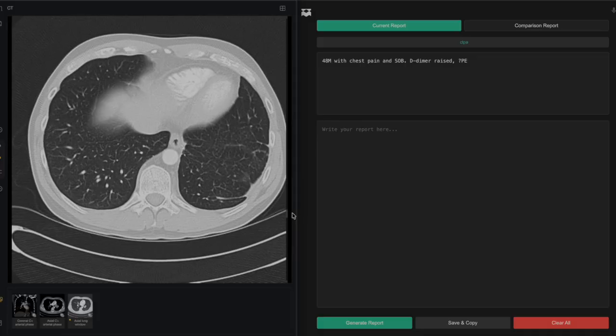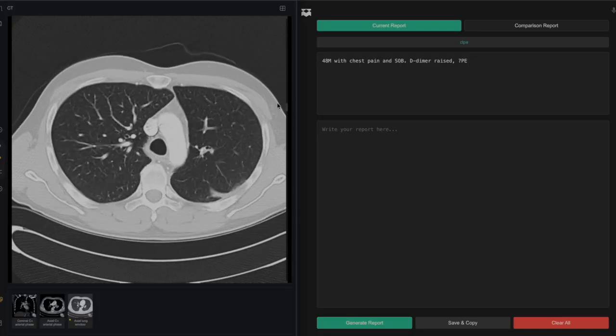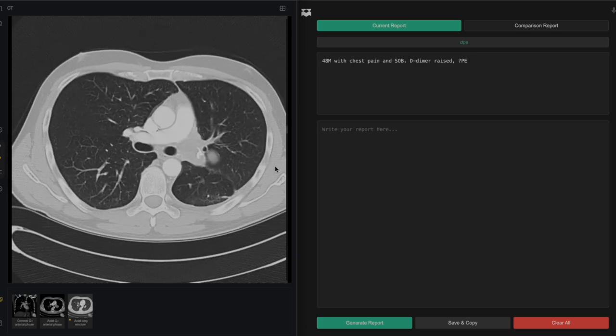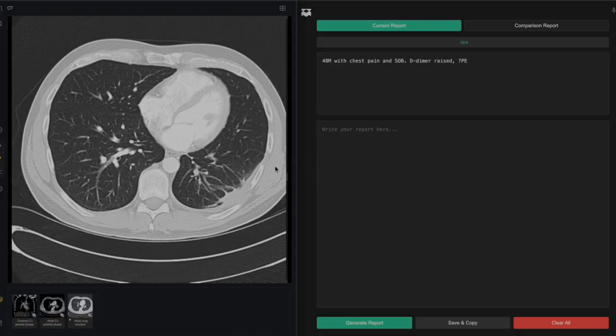Now we can scroll through the lungs on lung windows first. Might be a touch of atelectasis in the left base. And as we're coming past the mediastinum, we can see there is the impression of a mass-like density sitting there. We're not really characterising that well on these lung windows, but we will definitely come back and have a look at another point. Lungs otherwise look relatively clear.